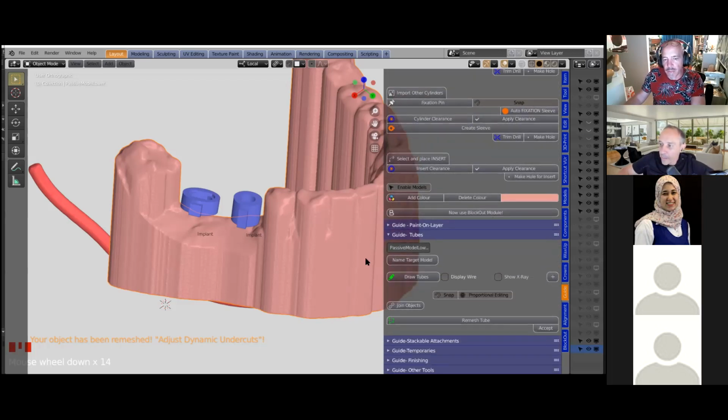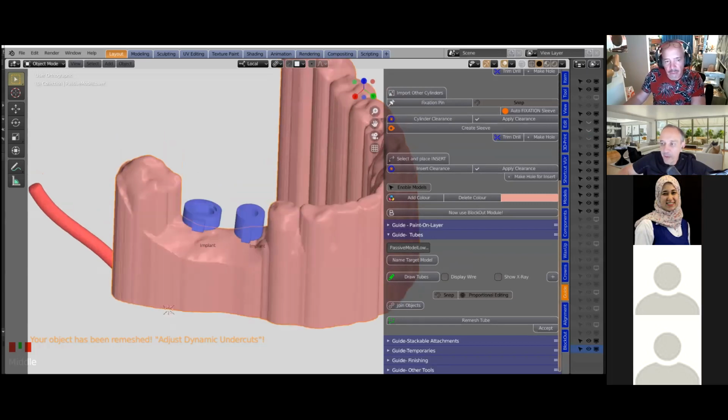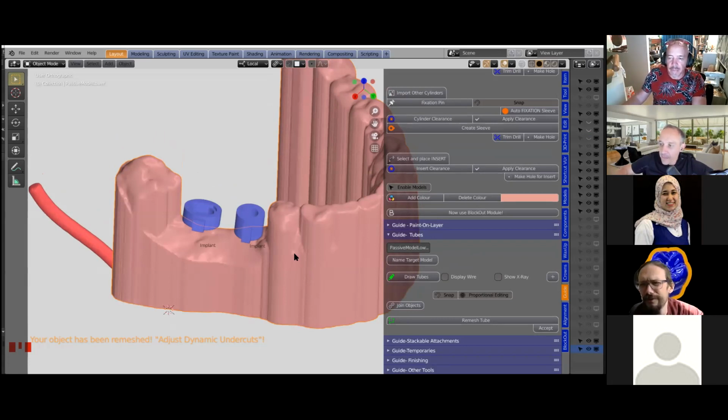I don't know. Maybe make a tube. Whatever. What should we make? Maybe put it to our audience. Yeah, good question. You know, there's a choice. We can do one or the other. Do a tube. I'm not good with a tube. You're not good. Okay.